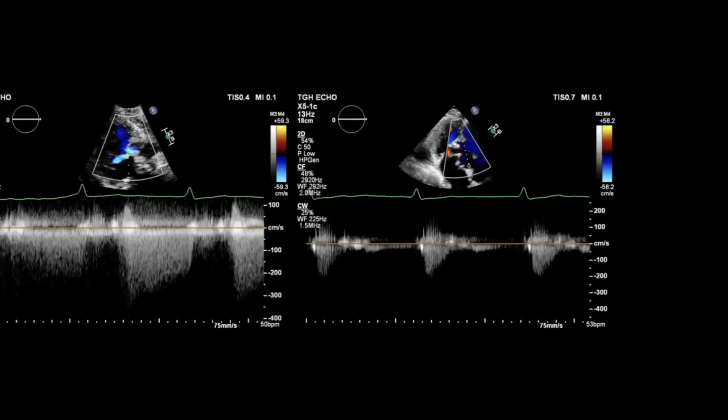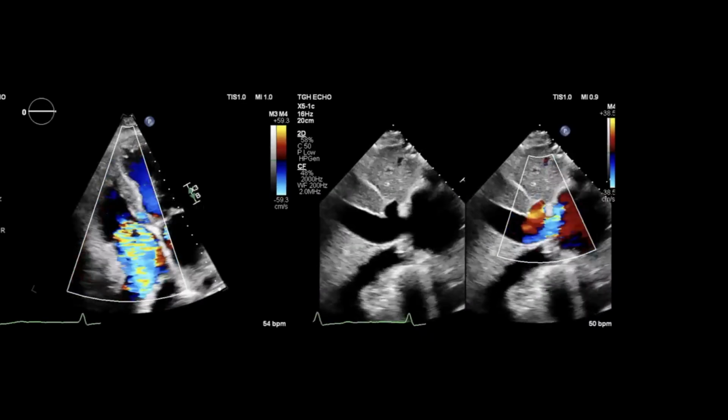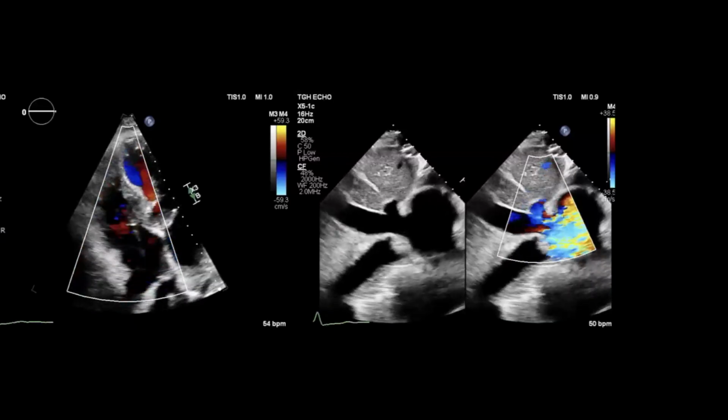They had a very difficult time, just based on the orientation, trying to get a proper Doppler signal across the valve, but I think from the color Doppler signal we could see. And then they tried again, it was just very off axis trying to get flow across the aorta to show the severity of the AI. You can see there's some trailing. This patient was also volume overloaded with severe TR. Device as well.